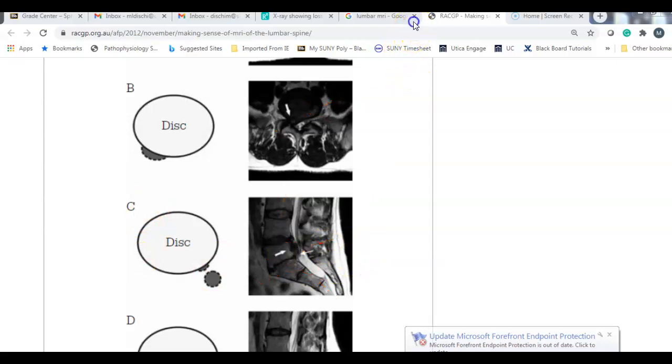So looking at that, here's the vertebral bodies, here's the spinous processes, and in between them, in that round hole, if you look down inside of a vertebra, is the spinal cord. And this was a really great MRI. There's a huge herniation. I'll erase it in just a second. You can see it almost goes completely across that space that the spinal cord comes through. And that should be open. And you should see this white spinal cord coming down in that white open area, but it's not. This person has an absolutely huge herniation.